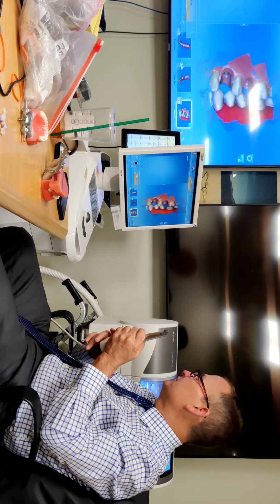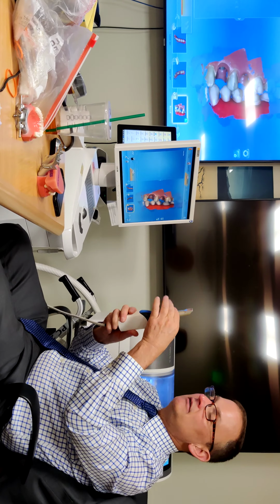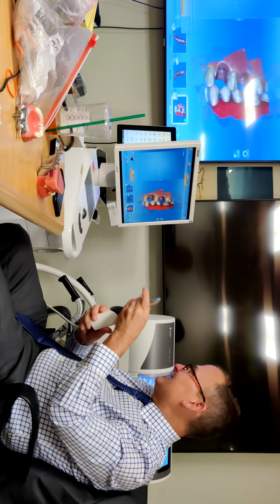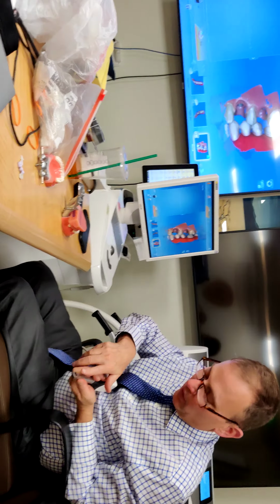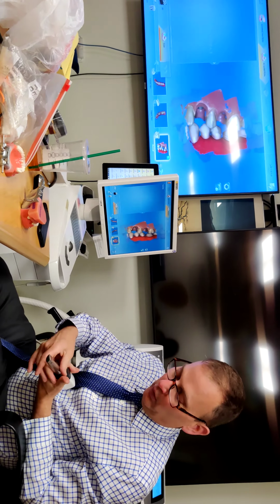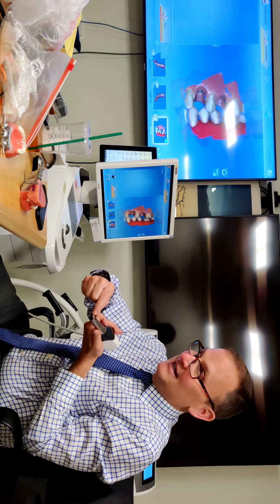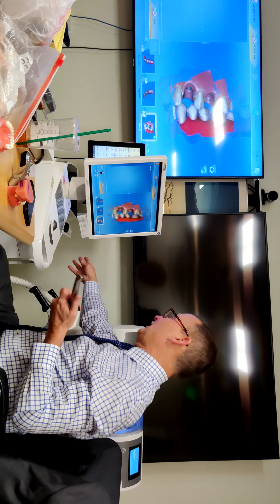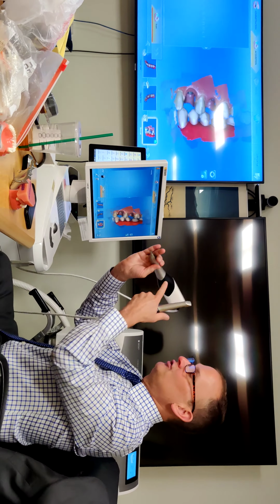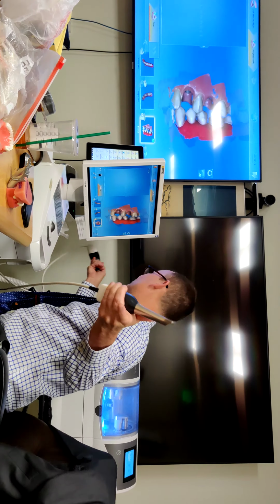On the Prime Scan, they're making these where they can be sterilized or plastic, or the whole thing is plastic and disposable, or this part is reusable and can be sterilized, and the glass is plastic and gets thrown away. So they're going to have 4 options for how to reprocess this, versus the 3 options with this.